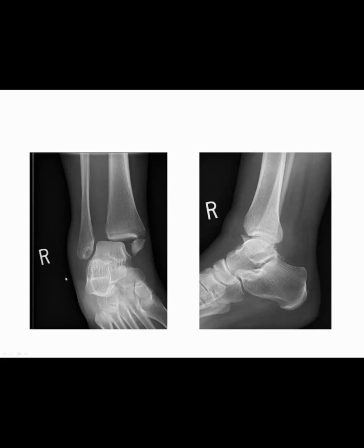So applying our approach to our ankle radiographs in the case module, assessing for alignment, I'm immediately drawn to the fact that there is widening of the distal tibiofibular syndesmosis as well as widening of the medial clear space. So therefore we cannot say that our mortise joint is congruent. However, the lateral clear space appears to be in appropriate alignment. And then looking here at the subtalar joint, this looks to also be in appropriate alignment as well.